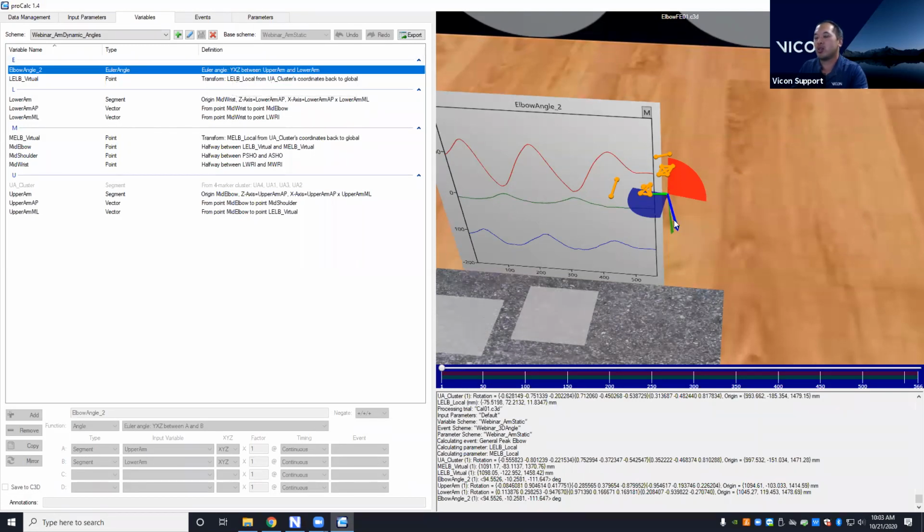The X will be your green axis, and the Z will still be your blue axis, despite the segment definition showing slightly different. I hope that makes sense to you guys. And again, I should have explained that earlier. I'm sorry. But yeah, your colors here will correspond to the order of rotations here, as opposed to the segment orientations that you had earlier.